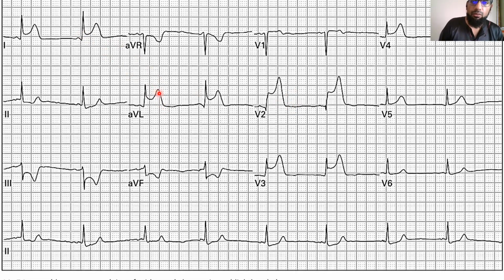Now, the thing is, if you want to know how bad your patient is, look at how many blocks are involved. Now, there are strict criteria, and in fact, physicians and cardiologists have strict rules. If your accumulative blocks are so much, you're getting to this point, you're getting to that point, it guides them on ICU management. But remember, we're not too worried about ICU management, we're worried about emergency management. But this should already tell you that quite a bit of the heart is involved, and it's involved quite badly. So in other words, this is not the type of patient to do your ECG on, you then go out, have a cigarette, come back, chat with everybody, and then continue. No, this patient needs your full and undivided attention, right?